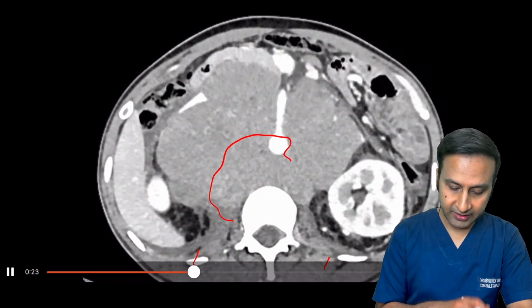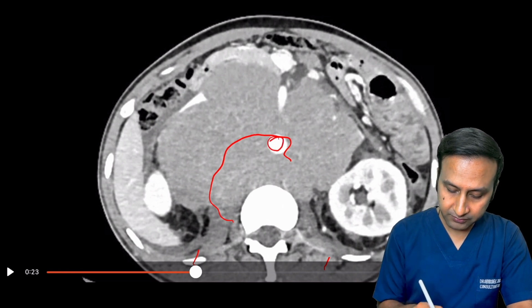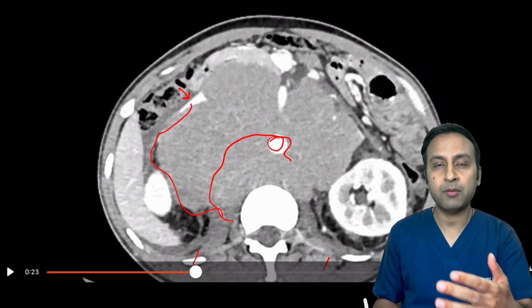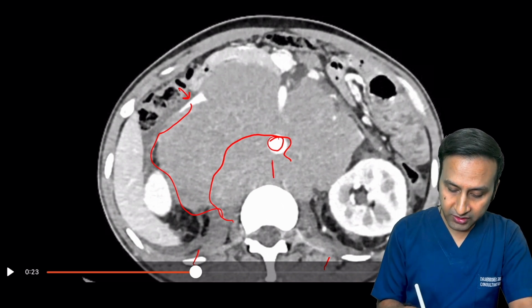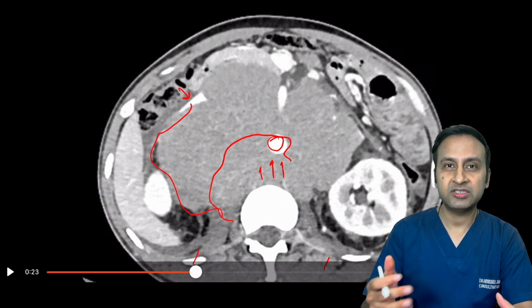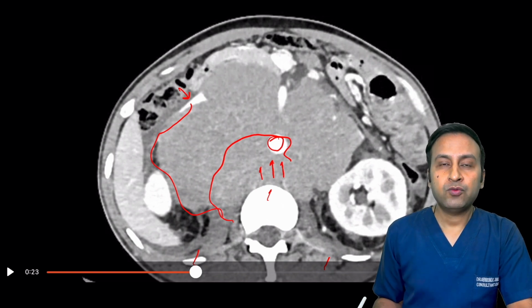Now, here exactly, I want you to have a look at the aorta. This aorta is present here. This is all that soft tissue. The IVC has been pushed so far apart anteriorly. This aorta also has been pushed from its native position because now we can see that there is a soft tissue which is lying posterior to the aorta, between the vertebral bodies and the aortic wall posteriorly.